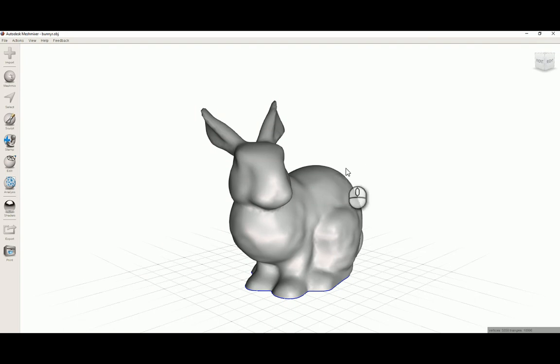The first project that was released by D3 Tool was D3 Splint. If you're not familiar, you can check that out as well. Patrick Moore is the lead developer on that. The second release is a project that I've been involved with called D3Mesh. It's specifically designed to work with Autodesk Mesh Mixer. It's a really common app that we use all the time for common dental tasks and workflows. So I thought it'd be nice to have something that could make that a little bit easier.